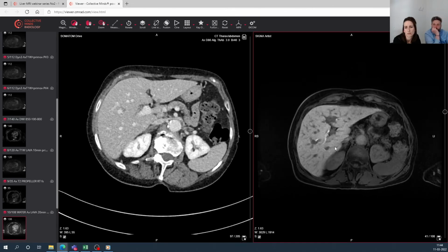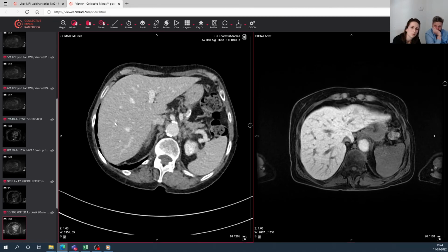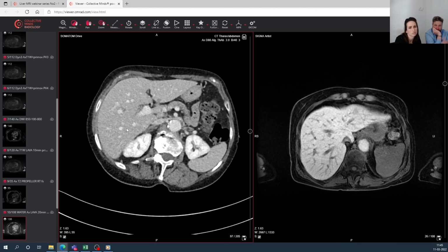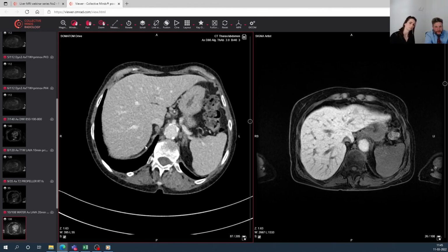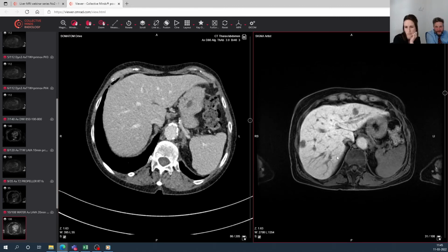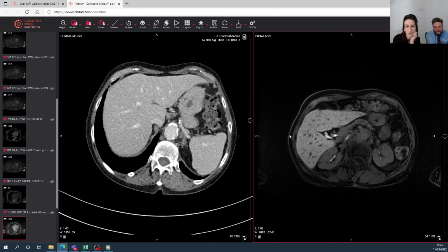And I noticed actually over here, we already have four lesions now. Do we see it back on CT? It's more gradual. Not really, it's difficult to detect. Maybe it's here, I think. Yeah. So in retrospect, there are four lesions on CT. And I didn't recognize another lesion.